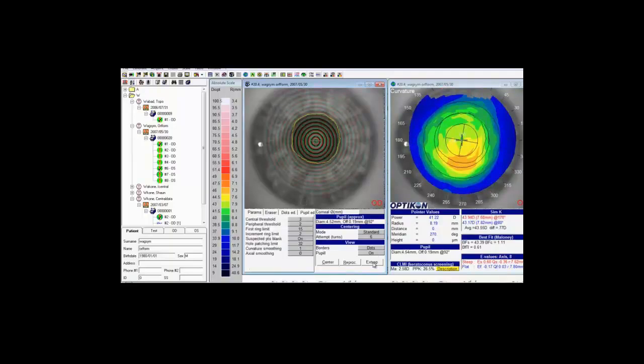And now to extrapolate, hit the extrapolate button, and you want to click on the limbal border on the temporal side of the cornea, and then drag this white dotted line to get the data centered as best as you can. It's not necessarily on the limbus on the nasal side. You just want to center the data. So we're about here. And then click there. And then to open up a wave design, simply click on the wave logo.